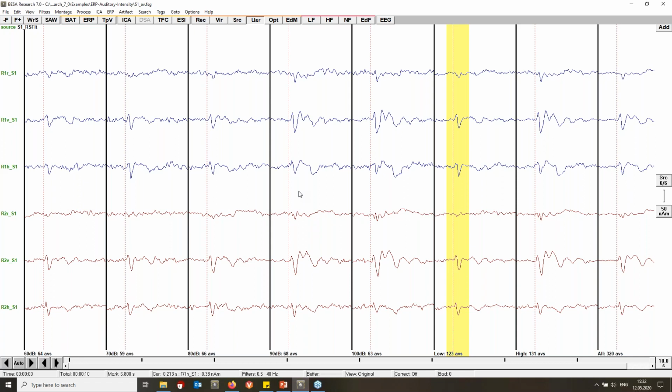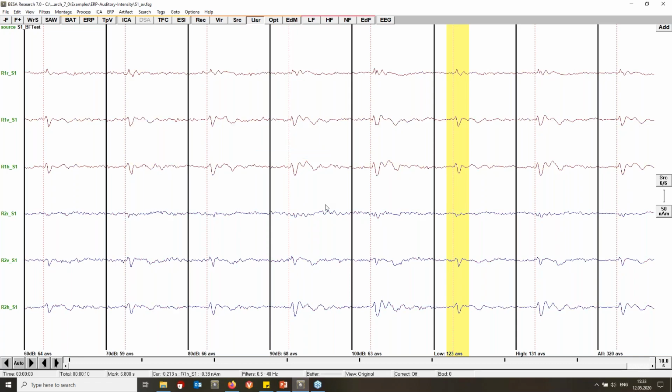Here we have a problem with the traditional source montage because it doesn't model all the active brain regions, whereas the beamformer source montage contrasts against other brain regions, so it isn't so strongly affected by this. So here we do have an advantage of this virtual source scenario using the beamformers.